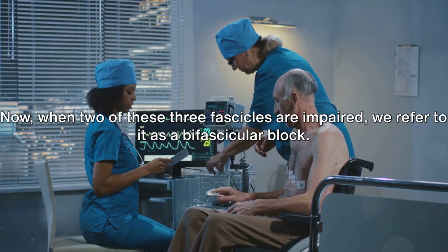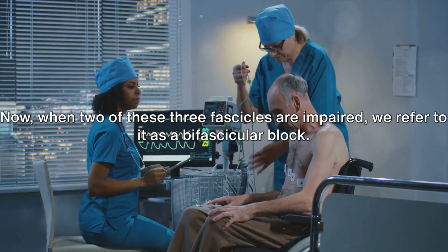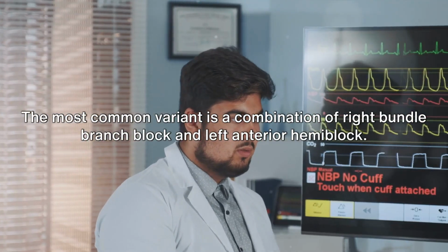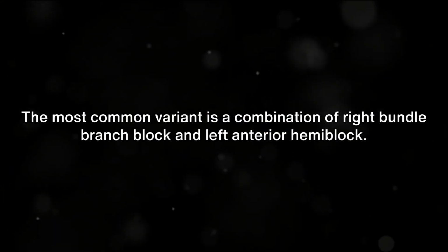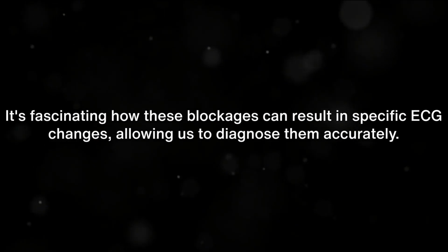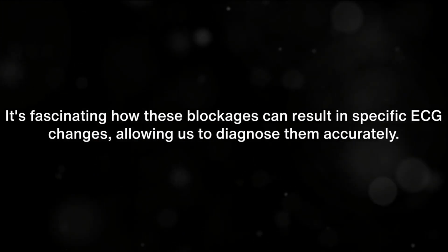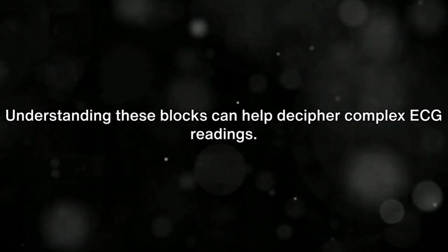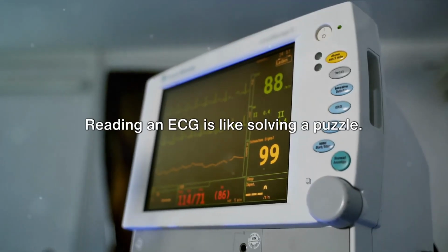Now, when two of these three fascicles are impaired, we refer to it as a bifascicular block. The most common variant is a combination of right bundle branch block and left anterior hemiblock. It's fascinating how these blockages can result in specific ECG changes, allowing us to diagnose them accurately. Understanding these blocks can help decipher complex ECG readings. Reading an ECG is like solving a puzzle.